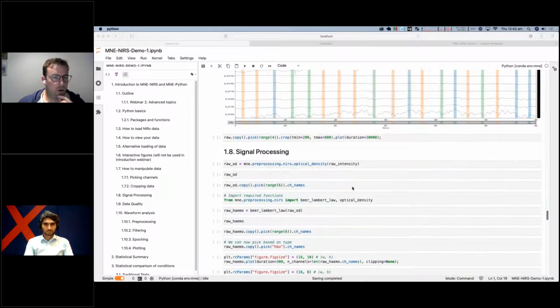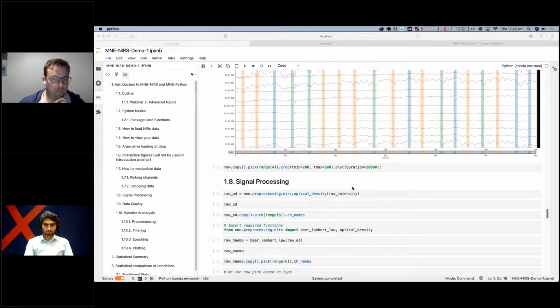All right, so that's all the kind of manipulation of data I was going to go through. Just checking the time.